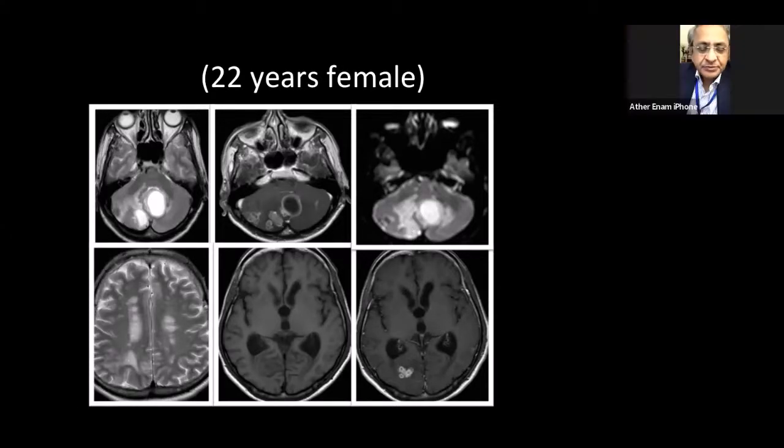One thing I also think is that a lot of people don't have access to high quality MRI in Pakistan. On a 0.3 Tesla, a contrast enhancing study gives two plates, T1, T2 and T1 with contrast. But what you showed in the right lower image was so typical of TB. So I just wanted to point that out.